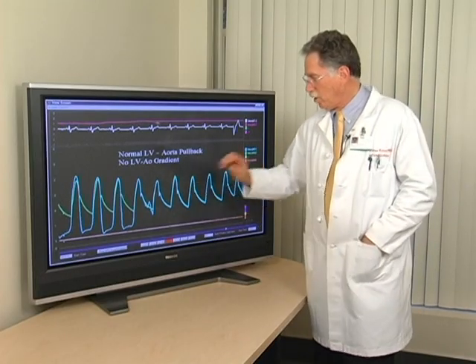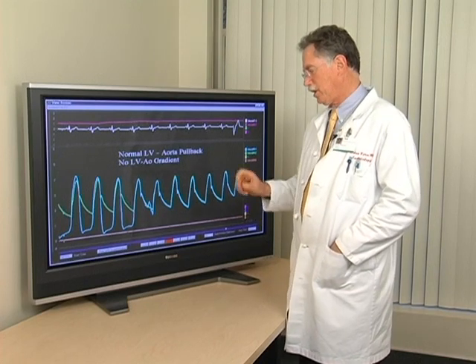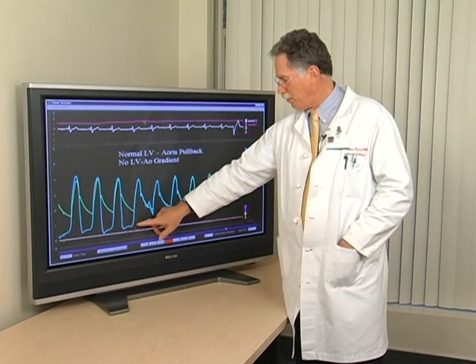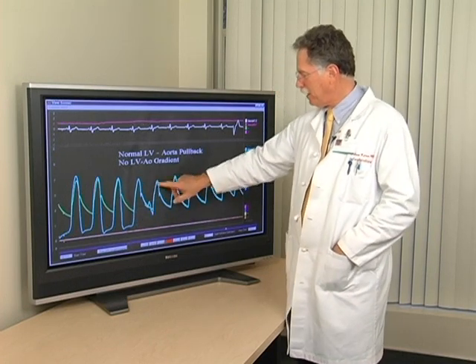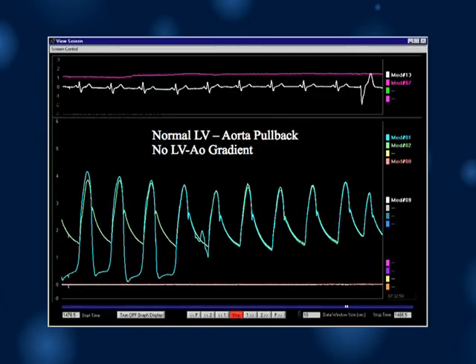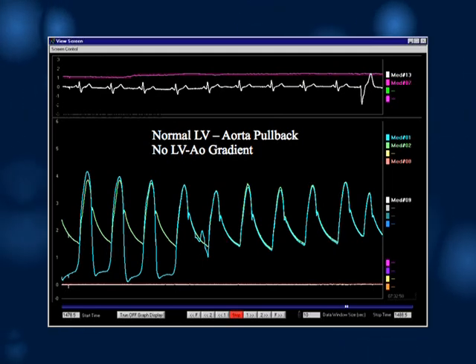When we go to look at the aortic valve, we measure this with the difference across the LV and aortic pressure, and we do a catheter-based pullback. We pull the catheter from the ventricle back to the aorta, and the two pressure tracings then match, indicating the aortic valve is not producing any resistance to flow. We will see that pullback without two pressure transducers can make for a complicated interpretation, and I believe is an inaccurate method to assess the aortic valve.